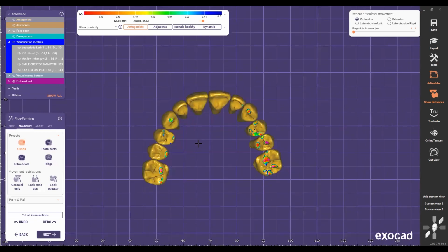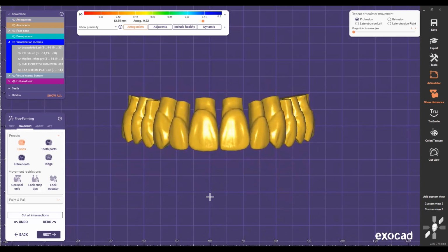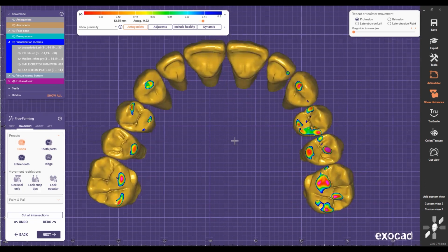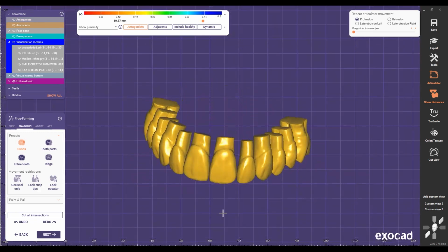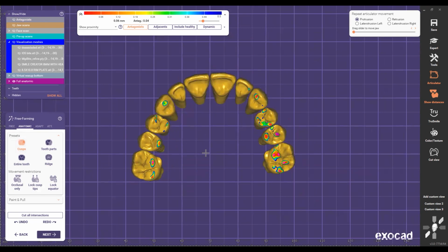So from here, if I want to save this teeth setup for future cases, I can make an ideal, fix everything and make it look nice, so that I can reuse them for future cases as well. Then you can create your nice setup library, save them, and reuse them as wax ups later. So now from here, I'm going to go ahead and start closing.